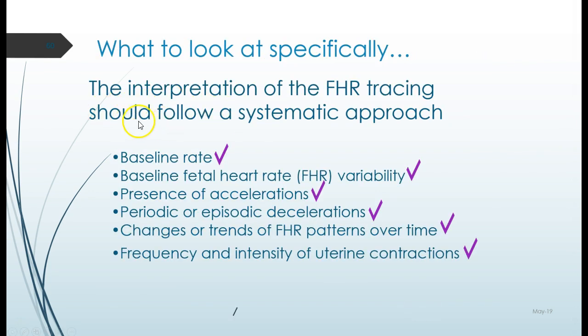We said that through this, you're going to be able to interpret the fetal monitor by looking at the baseline rate. Hopefully you can look at a strip and tell where it's hanging out most of the time. Talk about the variability. How much fuzzy is on that baseline? Variability is a baseline characteristic. Then we have the presence of accelerations. Do you see an increase in that heart rate? At least 15 beats above its baseline for at least 15 seconds.